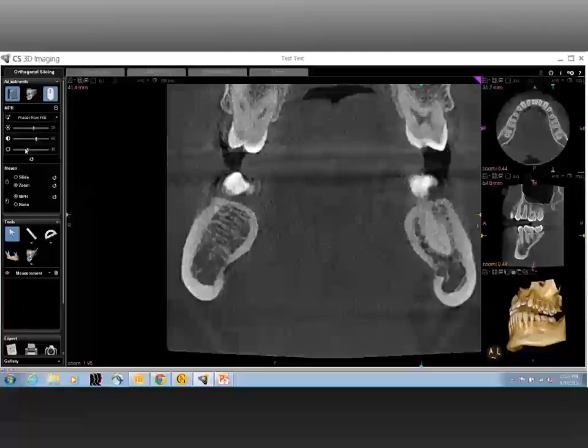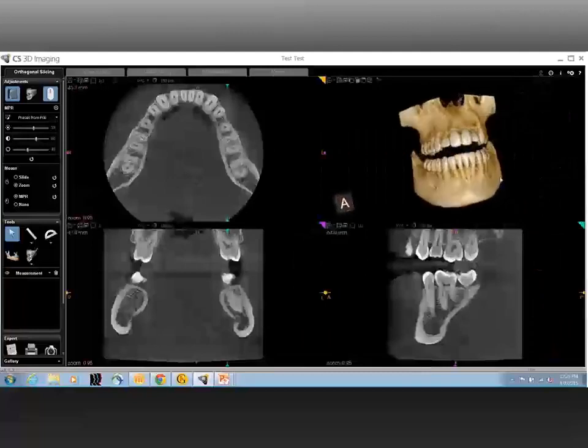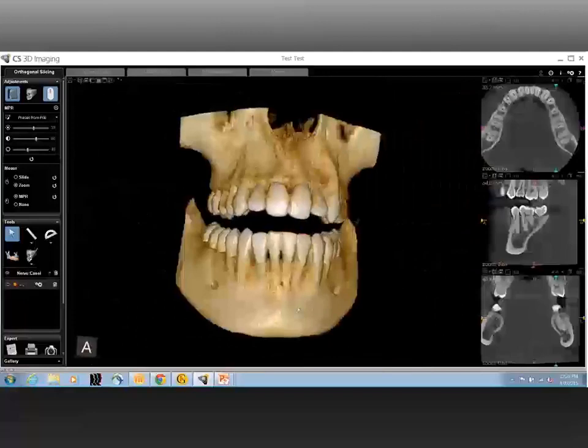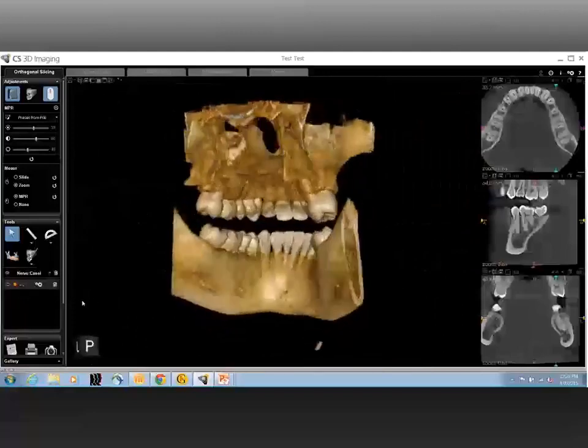What other anatomical structures, if any, do you focus in on? To pick up from the previous question, yes, that is absolutely correct. Those are the three things to start with. And of course, as we expand the horizon into interpreting or going through the images, a few things to look for. Number one, the inferior alveolar nerve canal. Now, everyone knows that that's one of the most critical structures that exists in the mandible. So identifying the inferior alveolar nerve canal, identifying the course of the inferior alveolar nerve canal is very important.